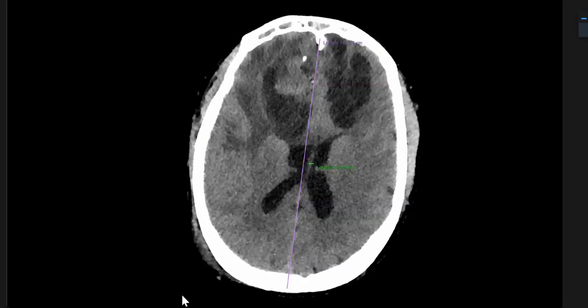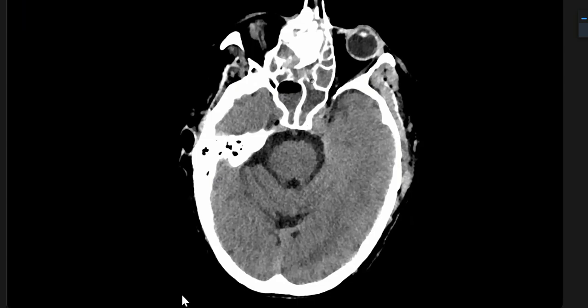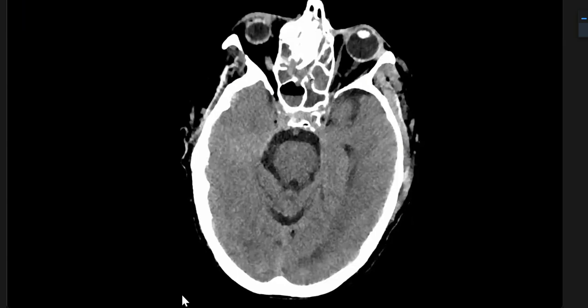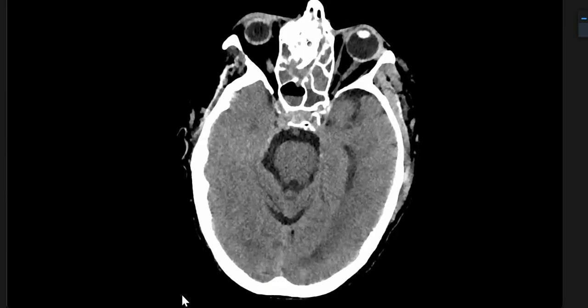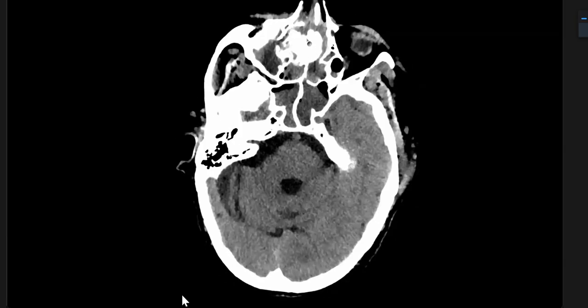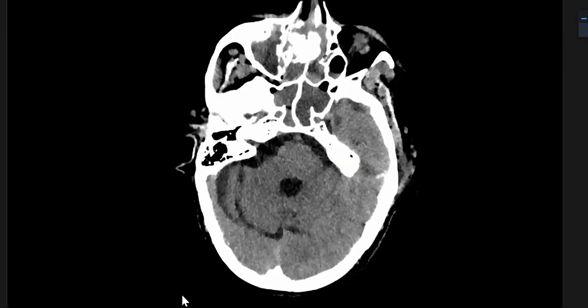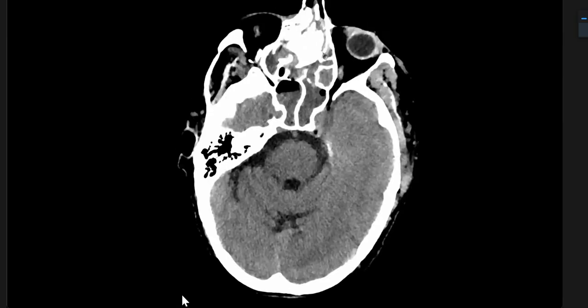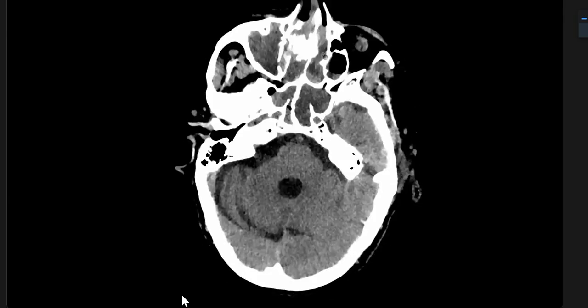This is a classic CT scan. I can even diagnose here, but obviously post contrast, it's a giveaway. You see there's a lot of soft tissue filling of these paranasal sinuses, especially the ethmoid air cells, and a lot of bone sclerosis. I wouldn't call it bone damage or destruction. I would say it's bone remodeling and sclerosis.